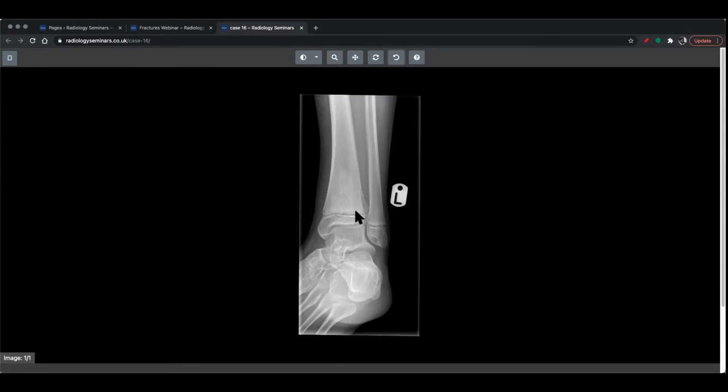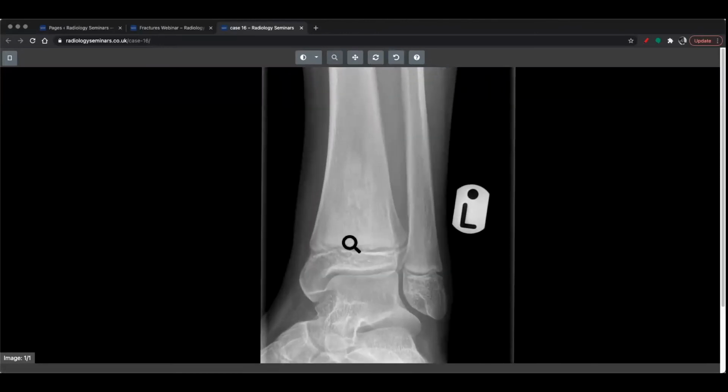Differentials could be, yes, it could be Ewing sarcoma. It could be all those things, but also because it comes all the way to the growth plate and doesn't go any further, you start to wonder whether this could be infection. It could be a Brodie's abscess. This patient could, exactly right, well done, have osteomyelitis, and that could be missed when someone's going through their reporting pile and they don't see it.